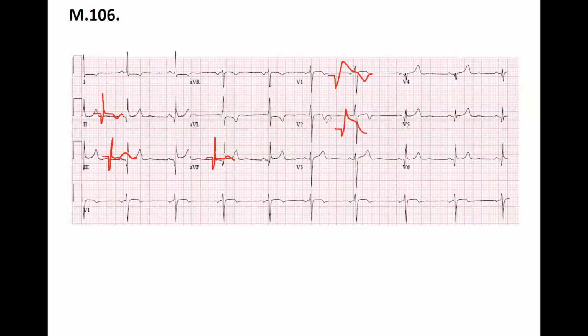Or something like that. So you do see ST elevation, and you can see pathological Q wave as well, doesn't matter. It means that you do have an acute ongoing MI in the anterior anteroseptal area, and you had an old MI in the inferior. But of course, if you have the anamnesis, you will see this patient had an MI earlier. Is that clear?